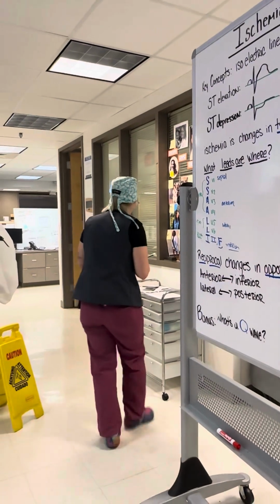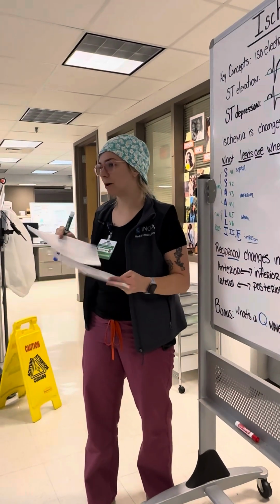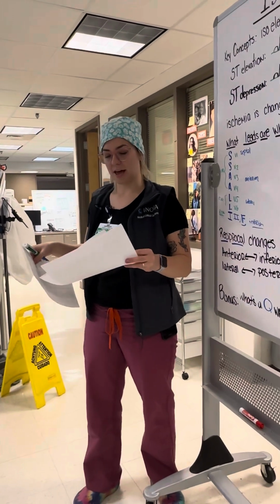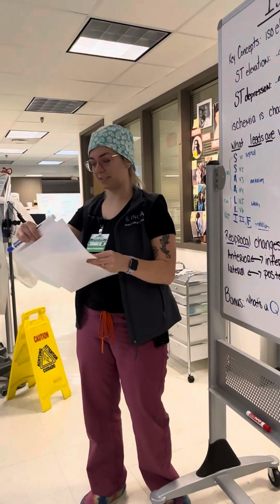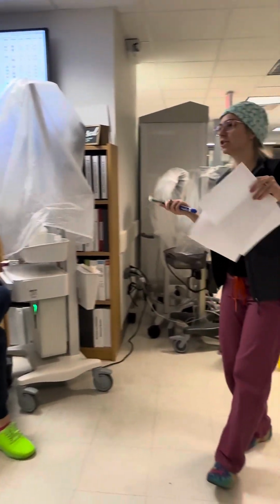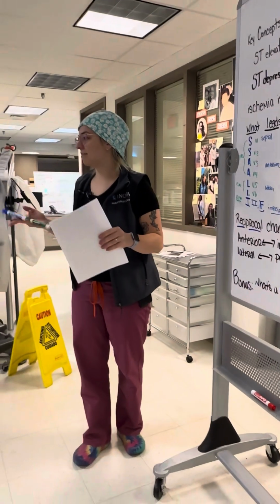I did print out a couple of 12 leads. The reason people wanted to learn about this today is that one of our patients has quite an interesting 12 lead, and we sat through this to work it through together, looking at ST elevations and depressions. I also have some pretty stereotypical changes, so I'll give you the stereotypical ones first. You can take a look and try to see if you can see ST elevations, depressions, and where they are. Is it a septal infarct, an anterior, lateral, or inferior?